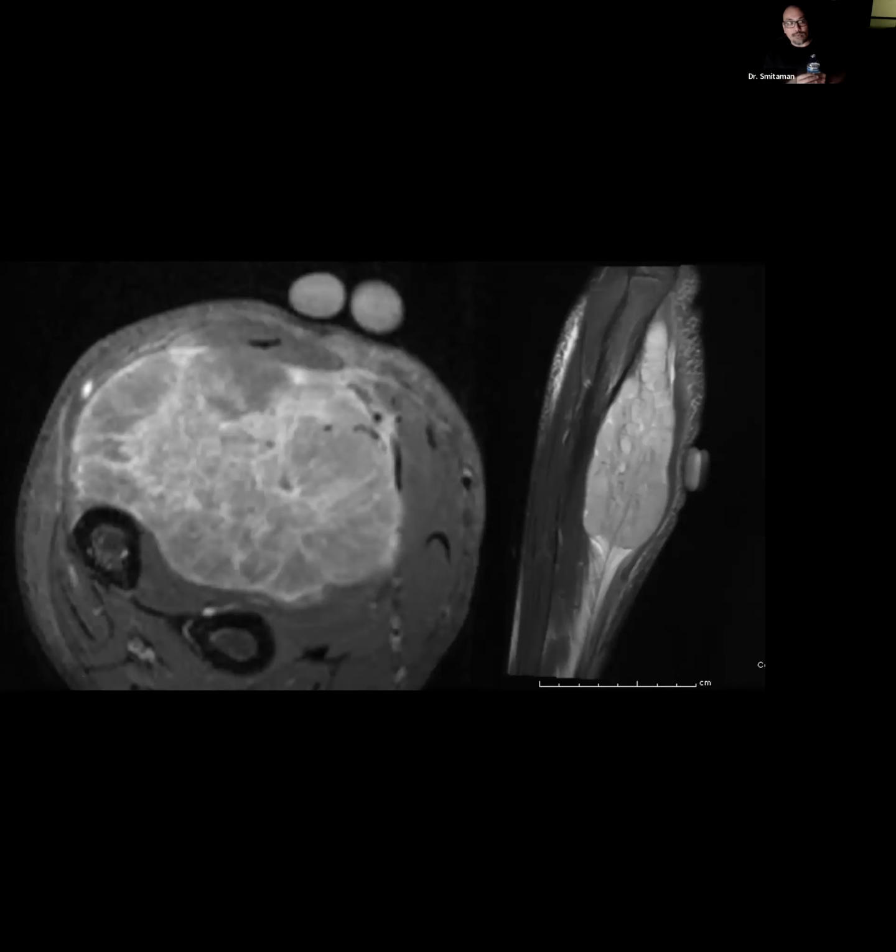Liposarcomas, which this case wasn't, neoplasms of fibrous origin, which this isn't, and lymphomas are typically the most common primary malignancies to involve muscle tissue. But this case, as I show here with the fiducial markers, turns out to be a rhabdomyosarcoma. Uncommon type of cancer involves the skeletal muscles and their precursors. And in most cases, unfortunately, this can occur in children at extramuscular sites, particularly the head, neck, and GU tract, as we know. But this case involved the forearm in this kiddo.